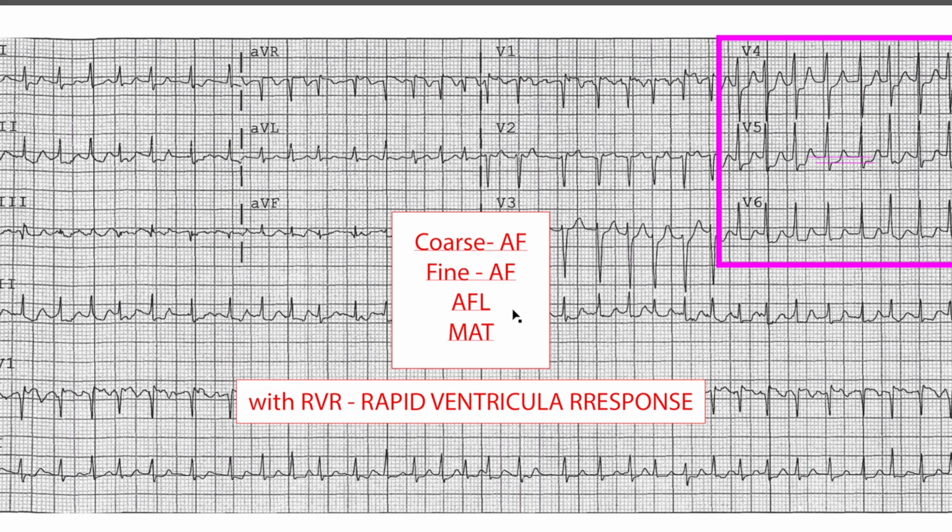I just wanted to discuss these briefly. Watch for these breaks. Try to capture them on an ECG. They are extremely helpful during diagnosis. And do not forget about this ST depression. Okay.